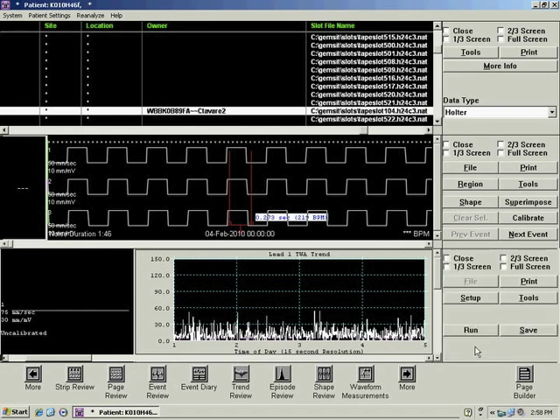Now, the software has generated one Excel file with all TWA analysis results for that patient. It would be possible to get the T-wave alternans values using just tools from the software, but using the Excel file makes the overreading simpler, since you can check all channels simultaneously, while on the MARS you have to check channel by channel.